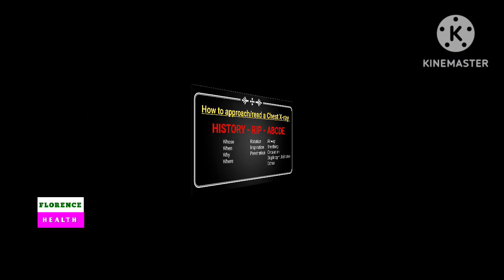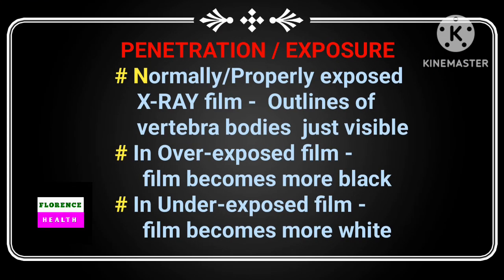Now let's discuss the criteria of a properly exposed X-ray film. The criterion is that outlines of vertebral bodies should be just visible. Again, outlines of vertebral bodies should be just visible. In an overexposed film, the film becomes more black. In an underexposed film, the film becomes more white. In an overexposed or underexposed film, vertebral bodies are not clearly visible. That's why you should ask for a fresh one.